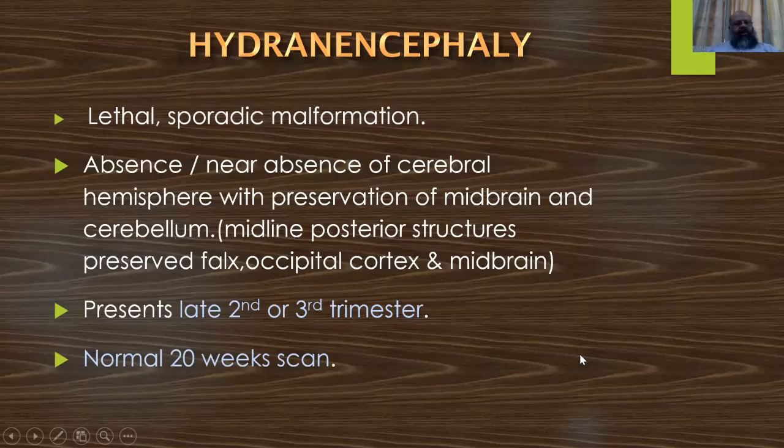Hydranencephaly is a lethal, sporadic malformation: absence or near absence of cerebral hemispheres with preservation of midbrain and cerebellum, midline posterior structures, preserved falx, occipital cortex, and midbrain. Presents late second or third trimester, with a normal 20th week scan.